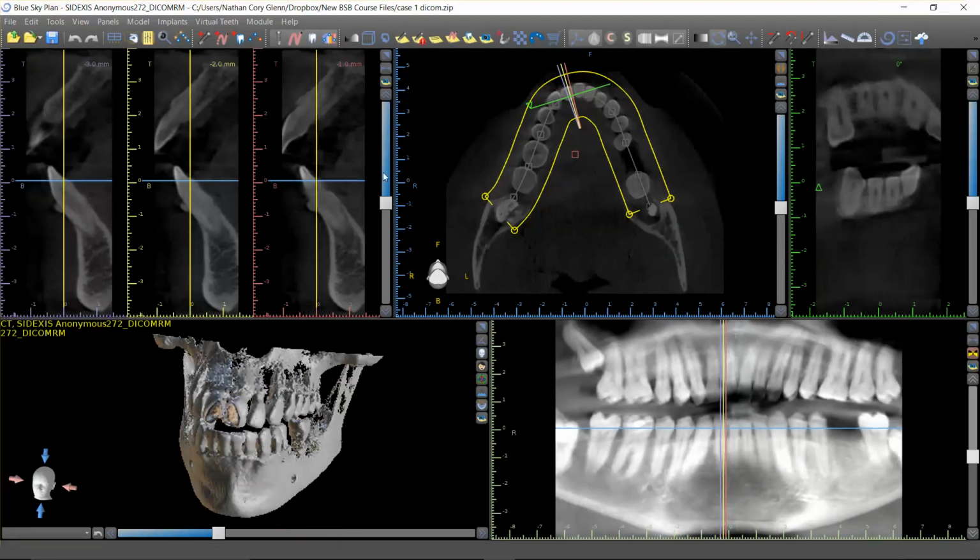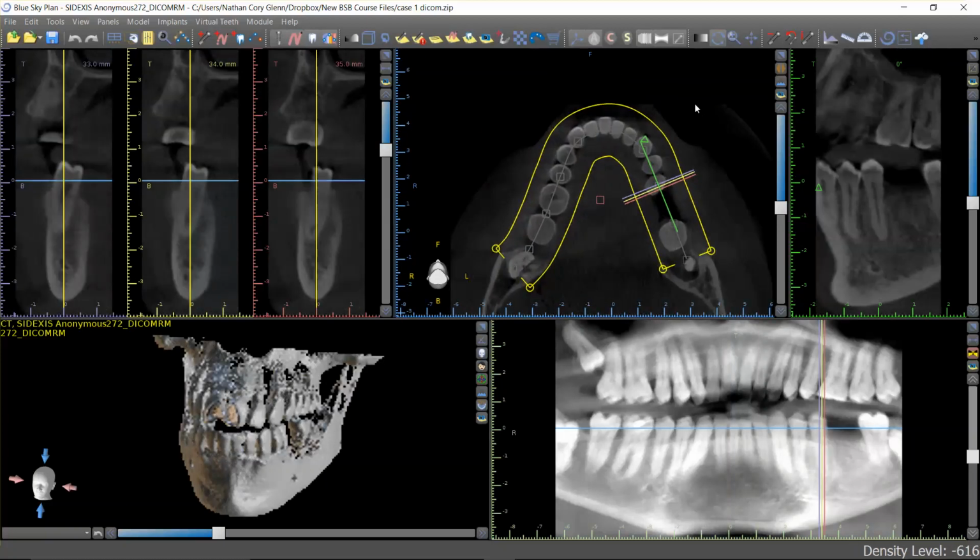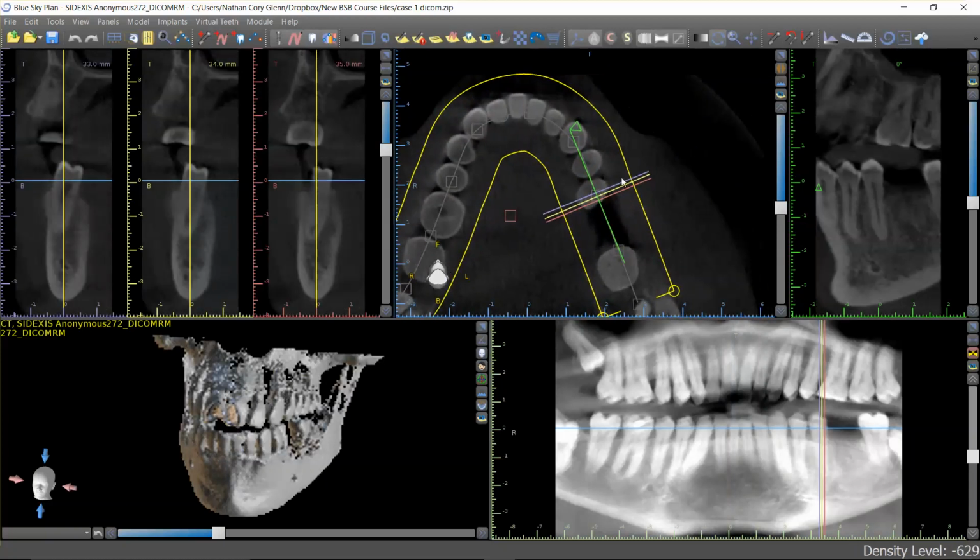Moving on to the window above that, this is your cross-sectional window. And remember, this is Implant Tangential 3. The 3 refers to having 3 cross-sectional views. You'll notice that this has a blue, yellow, and red marker over to the side, and those correspond, if I zoom in here, to the blue, yellow, and red lines in the cross section of your focal trough.